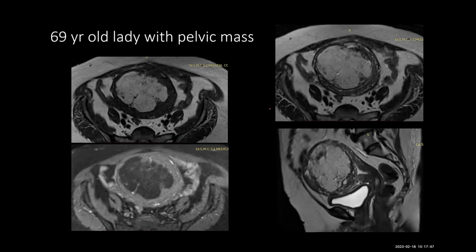All right, so these are the MRI pelvis images of the same patient. The T1 weighted image, as well as the T2 sagittal and T1 post-contrast images are available. I can appreciate that this lesion is T1... Sorry, Sadaf, let me just interrupt you. This is T1, and these two are T1 fat sat. Sorry for not naming them. Yeah, that's a T1 fat sat.